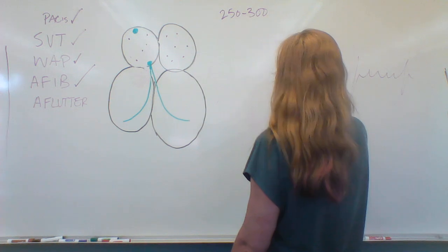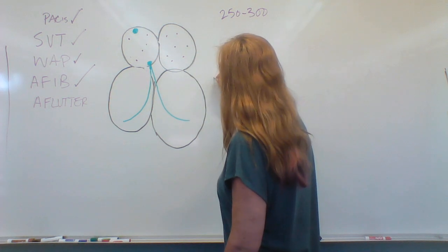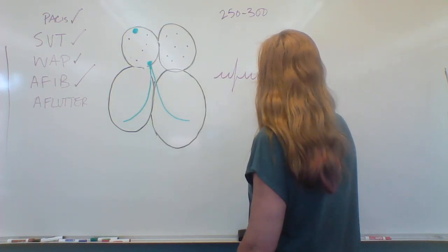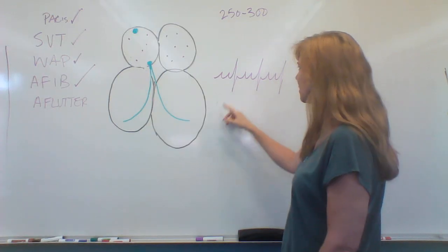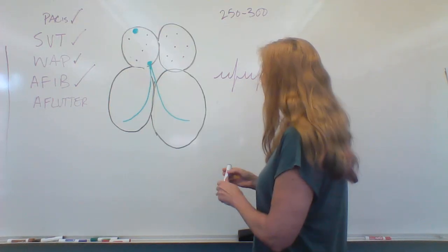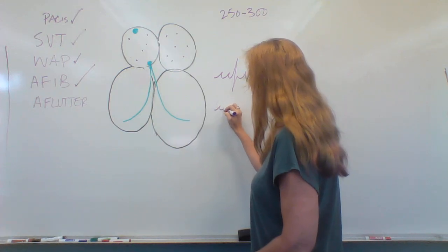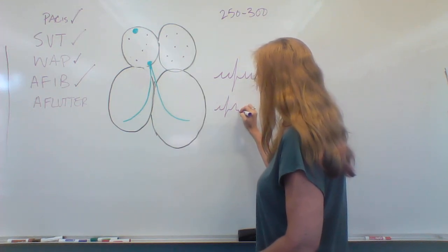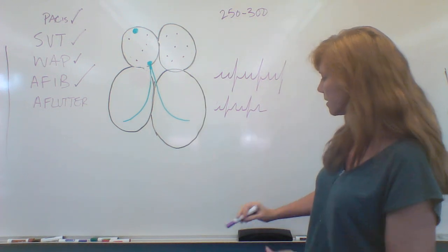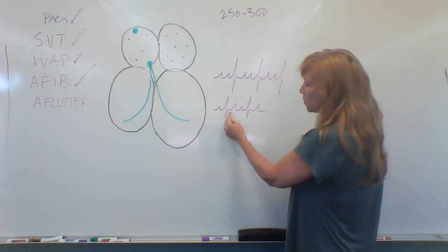It can be hard to tell it from sinus rhythm, because people have pointy waves. So when you get one that's like just a 1-2 QRS, 1-2 QRS, 1-2 QRS, and you're like, well, maybe that's just their P and that's their T or something, or maybe they're flutter waves. But even if people have pointy waves, a pointy P and a QRS, and a pointy T and a pointy P and a QRS, and a pointy T, see, there's a lot of similarity. But with P's and T's, there's a space in between for the QRS to occur.